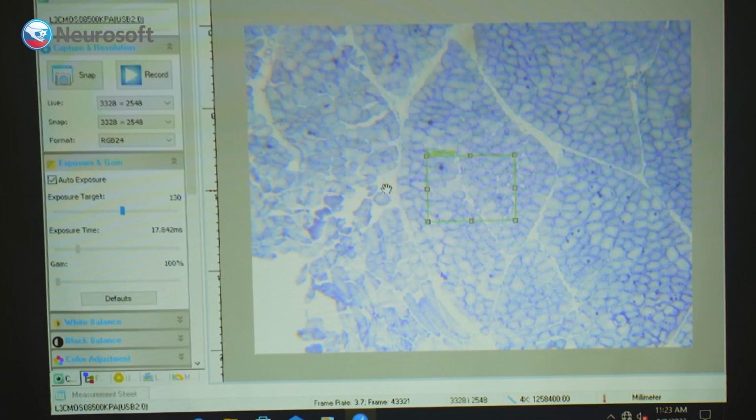In those cases, we see rimmed vacuoles or protein aggregates, which can be detected by P62 immunohistochemistry, which is more sensitive than modified Gomori trichrome. So that is something you may want to do. But I don't see anything like that on at least H&E and modified Gomori trichrome. So for me, this is non-specific.